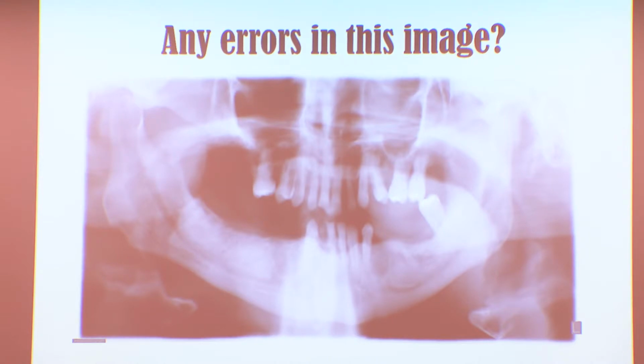Very tipped. And slumped a little. This patient's kind of like this in the machine. I think this was probably the best we could do for this patient. You can't always get a perfect image, but yeah, head is tipped down and to the left.